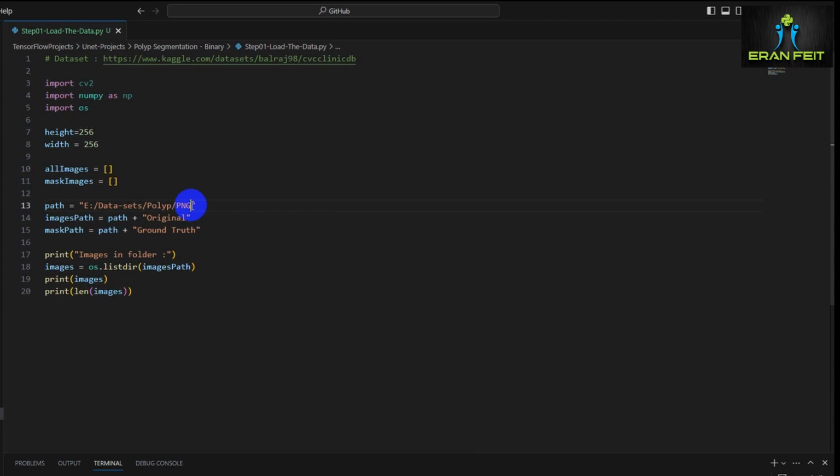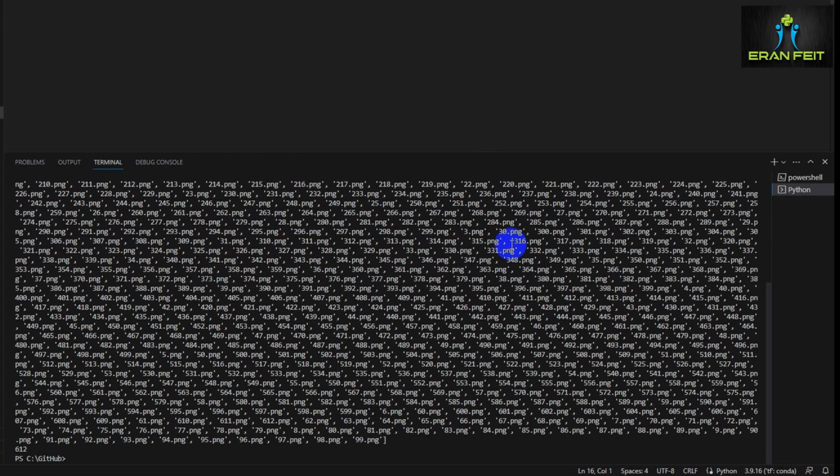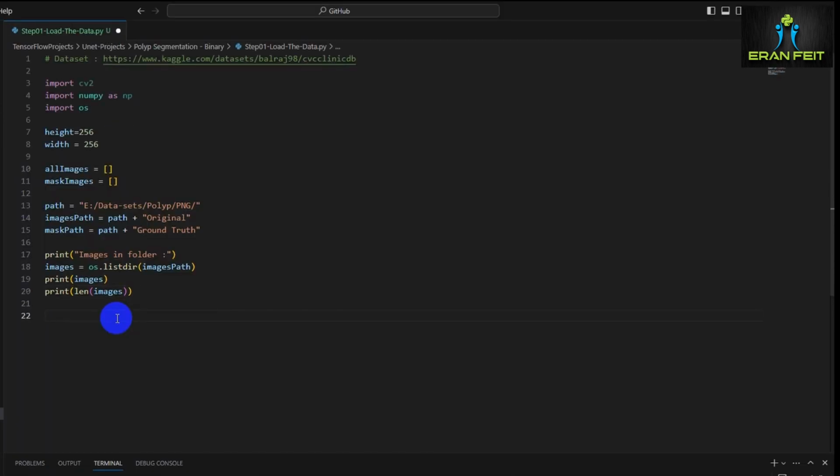I have a syntax error. Let's fix it. Forgot a slash. Okay, so these are the names of the files, and we have a total files of 612.